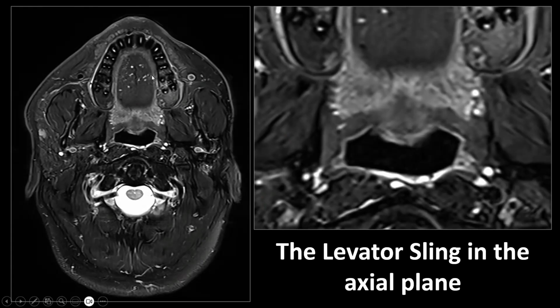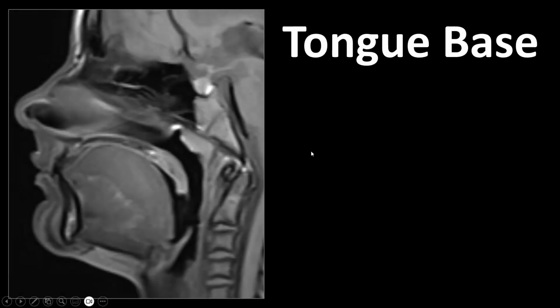Once again, here we see some partial volume of the tongue located against the hard palate. And at the back of it, we see the soft palate, and we can recognize the uvula, which has different signal characteristics, because the uvula is basically composed of two muscular structures, the uvular muscles, and we see the levator veli palatini forming a sling going to the uvula. Okay, and that concludes the soft palate.